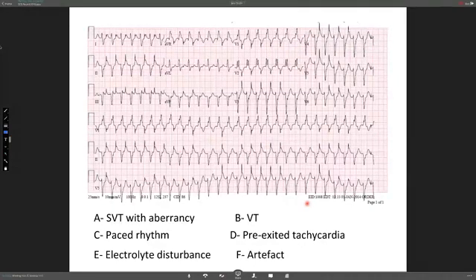Yeah, Fathi, before you go, I want to add about this spike, and then we'll take your comments. Right. So the main thing is this spike.